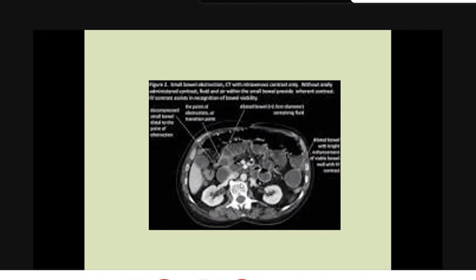Identifiable transition zone from dilated to non-dilated bowel loops. This is second. And the third sign, the presence of collapsed bowel loops distal to the transition zone. يعني راح أشوف dilated bowel loop أكثر من 2.5 cm diameter. وراها راح أشوف الترانزيشن زون اللي تفصل لي بين الأبستراكتد والنون أبستراكتد bowel loops. وراح أشوف بعدين the collapse small bowel loops which is non-obstructed.